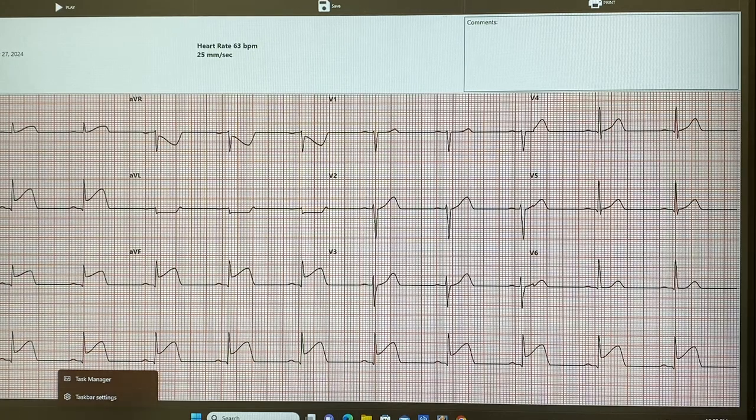And what about the T? The T seems elevated as well. Okay. And what is our comparison again? How tall should it be? It should only be 1/4 to 1/3 of the height of the R, but because the ST is elevated, naturally the T becomes elevated as well. Or not naturally, but in this case it's also elevated. It could be a tombstone where the T wave is not as tall, but just the same height, kind of flat. But it's not flat, it's also tall, which again validates the problem here.